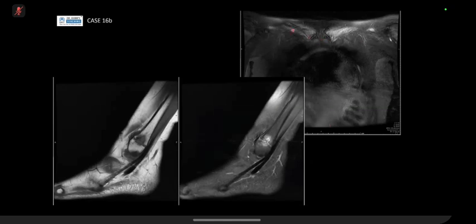So there's MR here now showing that on the right side you've got abnormal marrow edema. You can't appreciate the periosteal reaction as well, but maybe there's this elevation here and at the bottom. Also on the left side, so bilateral clavicular involvement, and in your tibia and fibula, and there's the fibula because you've got your peroneal tendons running along here. It's metaphyseal in region, along with the clavicles. You think, is this infection, but putting two and two together, you rightly got it as a CRMO.